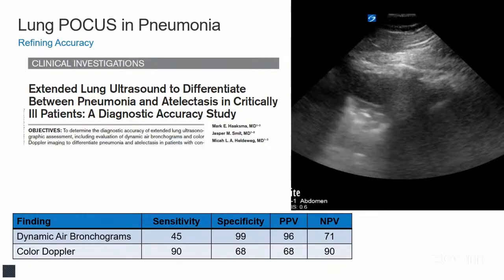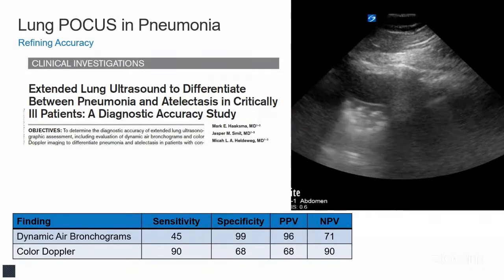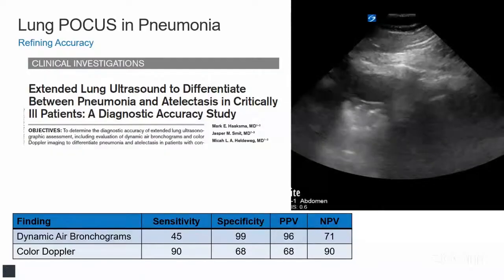They also added color Doppler of these to see whether you could have signs of hyperemia in your infected patient versus normal blood flow in your atelectatic patient.